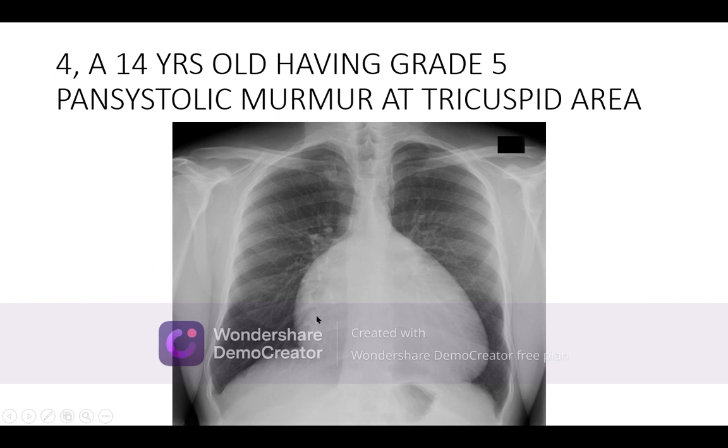It means that right-sided cardiomegaly is predominant in this condition, and there is increased pressure in the right ventricle. If there is any congenital abnormality causing increased pressure in the right atrium, right ventricle, and secondly involving the pulmonary artery, it increases the pressure in the pulmonary artery.